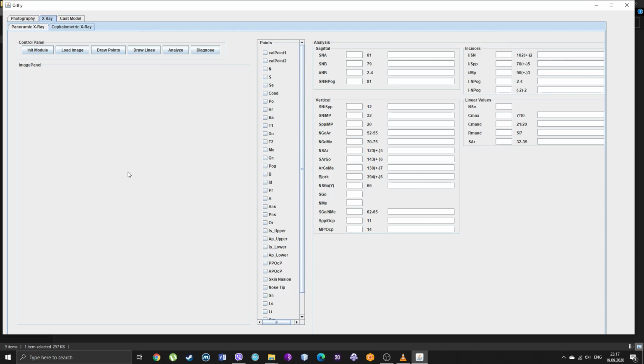So how do you make an analysis in this type of software? Basically, press this. I must point out this is very important: you must do everything as I say, because if you skip a step, there is no protection in the program from bugs.